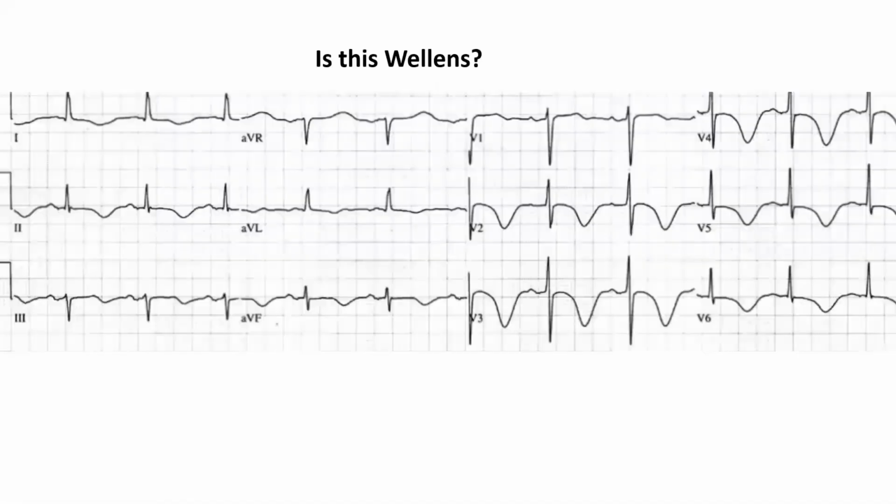Now, this is another case here. Is this Wellens syndrome? This is actually diffuse T inversion everywhere, and the answer is no. Yes, I agree with you. The answer is no, this is not Wellens, and here is why.